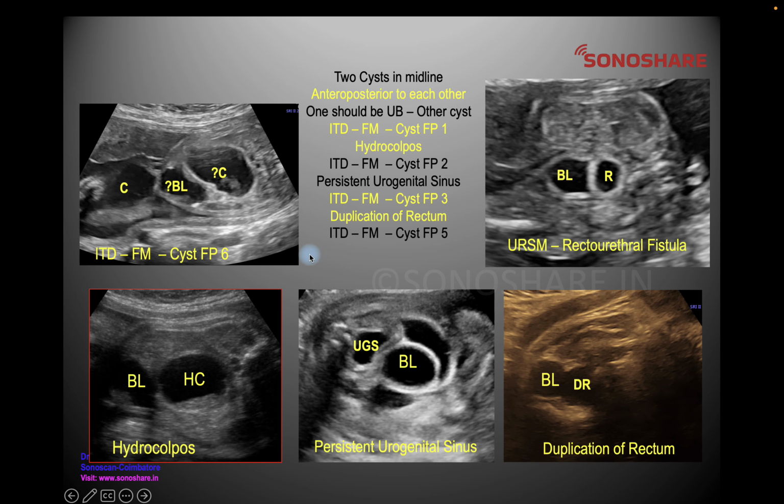Now here you see the cyst in the fetal pelvis, sixth in the series, and what does it turn out to be?